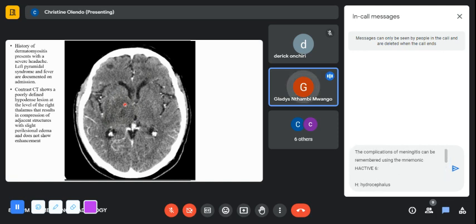Have you ever heard of something known as a stroke window? Have you heard of that, the stroke window? So you can actually reduce the window level. That makes the gray-white differentiation more marked, so that if there's any place whereby there's lack of clarity, lack of sharpness, then you can suspect there's a problem going on there. And it's very important, especially where you're suspecting there could be stroke, because you can now look for those subtle signs of early stroke.